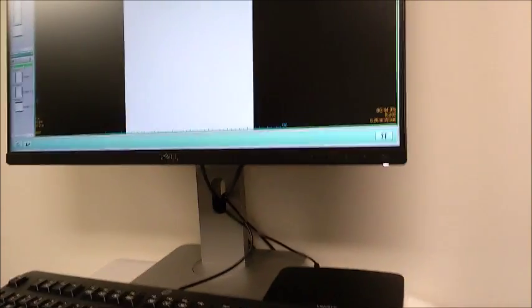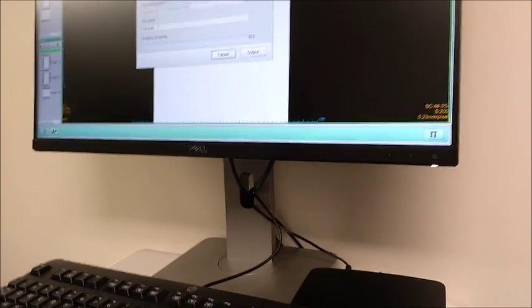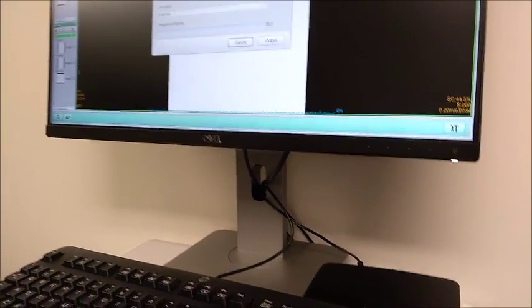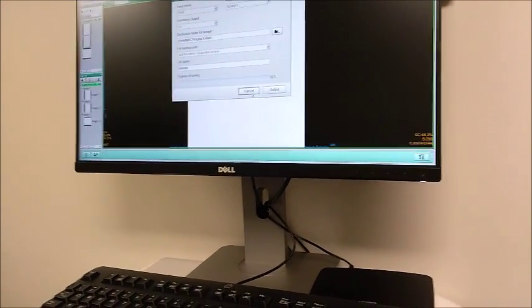And we're going to name it the same as the name of the study, which will be the Avimark ID number plus the patient name, the pet name, the animal name. Okay, got that.